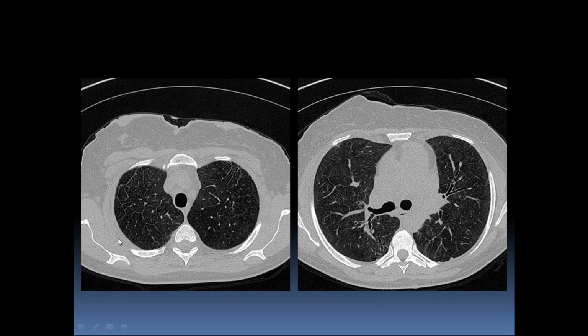So going to the imaging findings, what you can see here is some subtle ground glass within the apices. You can see that we're pretty high up into the lungs here. Here we're at the level of the carina. And what you see besides the ground glass is the interlobular septal thickening. This goes back to what we were talking about as far as the secondary lobular unit. You can actually see the pathology outlining the different areas within the lungs here.